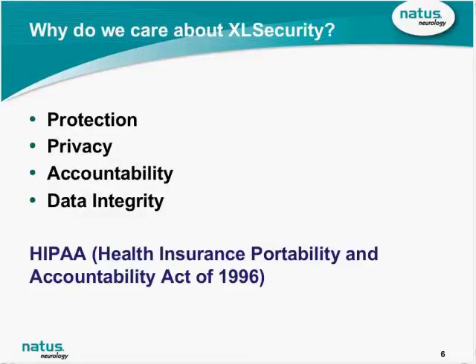The Natus XLTech software has considered the consequences of such actions, and the result of this discussion is XLSecurity. XLSecurity is designed to provide the end user, your entire site, with protection of data. It's designed to make end users more accountable for their actions while they are interacting with the software. And it's also designed to maintain the integrity of the data, preventing it from any kind of manipulation from outside or non-approved users. All of these principles, by the way, are encompassed in what is otherwise known as HIPAA, which stands for Health Insurance Portability and Accountability Act.